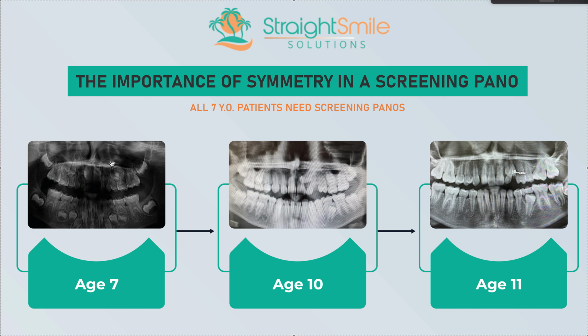So when you see symmetry, I mean, unless you know that it's clearly like the teeth on this side are all bigger and maybe there was an issue with your pano, but clearly there's no distortion on this pano. The only weird part is this blobbiness compared to that. This does not look like that, right? And then the other little weird thing is this. I noticed this was kind of veering off distally as opposed to that. So those are the 2 things I flagged.